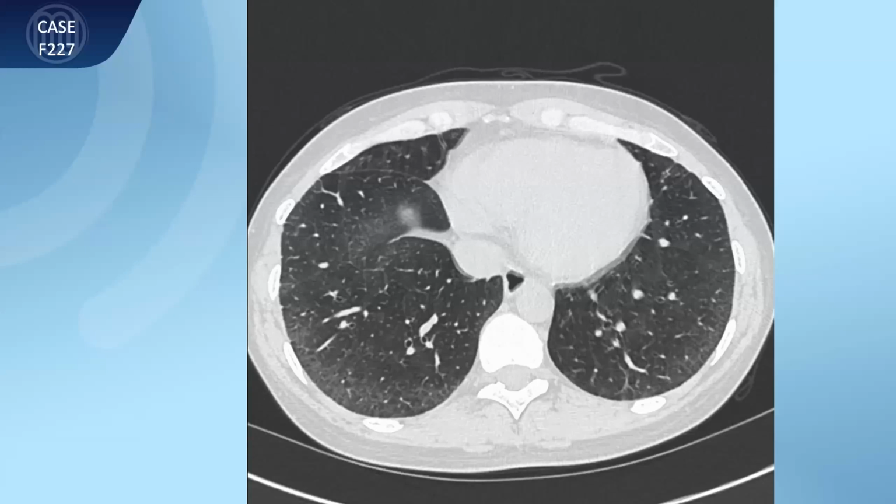There's another question, what is meant by subpleural sparing? I will come to that in a second. Thank you for raising that question. Hurricane artifacts, I don't know about that. I never heard about that term, so I can't really answer that one. If there is reticulation with traction bronchiectasis and minimal ground glass, how do we differentiate whether it's probable UIP or fibrotic NSIP? Great question. I hope we have enough time to get to the answer there. I have the answer prepared already, but it would go too far to answer it right now.